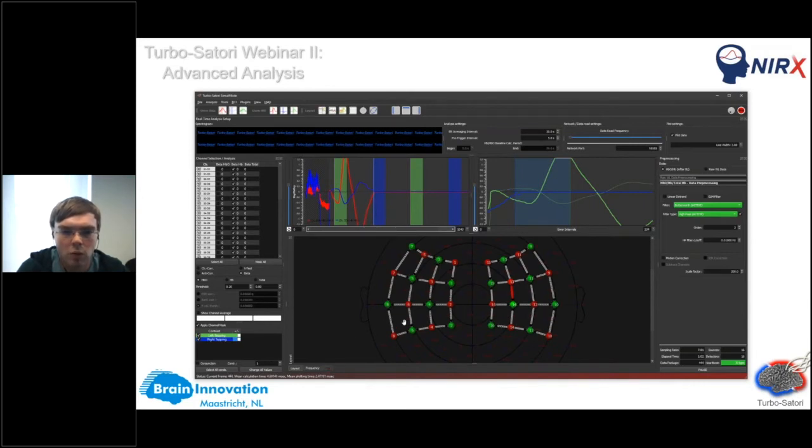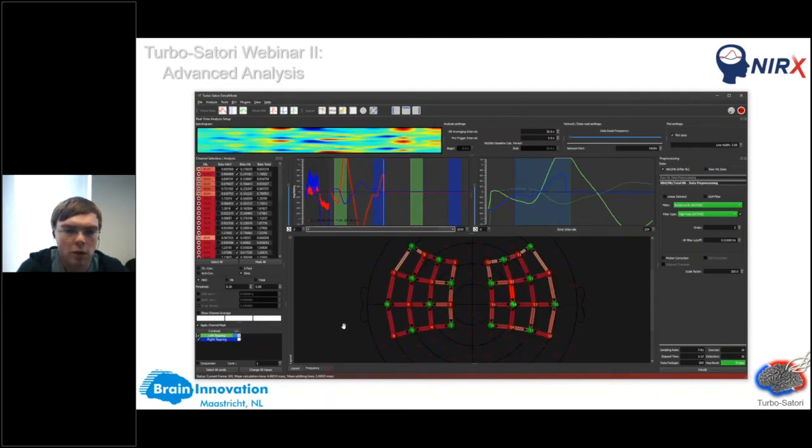And if you now want to see what is going on during this information, you can use the real-time statistics, which we were talking about last time, by just defining a little plus here, and then you would see immediately the statistics. So in this case, the beta values. It might look a bit too strong at the moment, so you can just increase the threshold, and then you easily get a nice view of the beta amplitude. And you can see already after one trial for the left tapping that you quite nicely form a specific cluster in the right hemisphere, as you would expect.